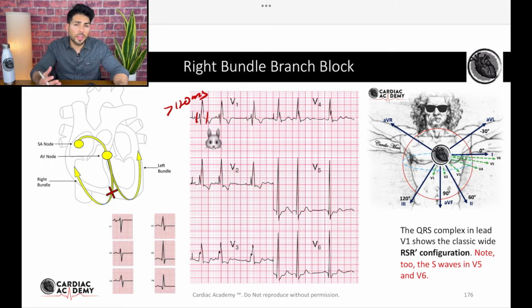And then the next thing you look for is that morphology, the rabbit ears, okay? You can see here how we have an R wave, an S wave, and an R prime. So those are the rabbit ears that we talked about. And also you're going to see that it's positive. It's a positive deflection in V1.